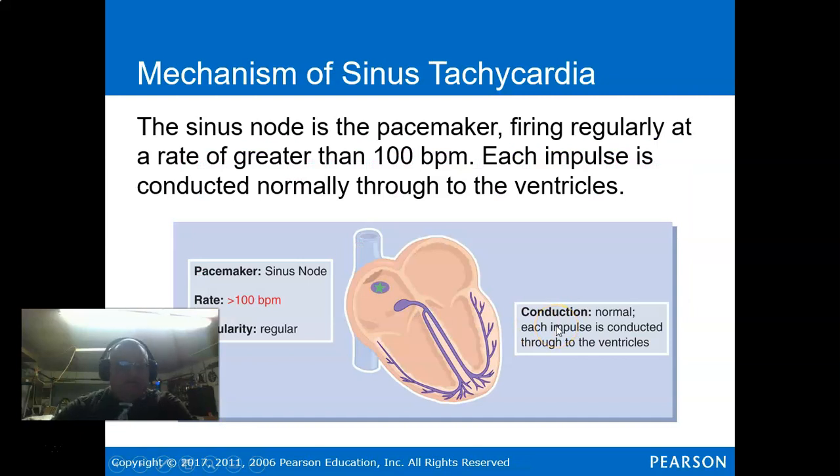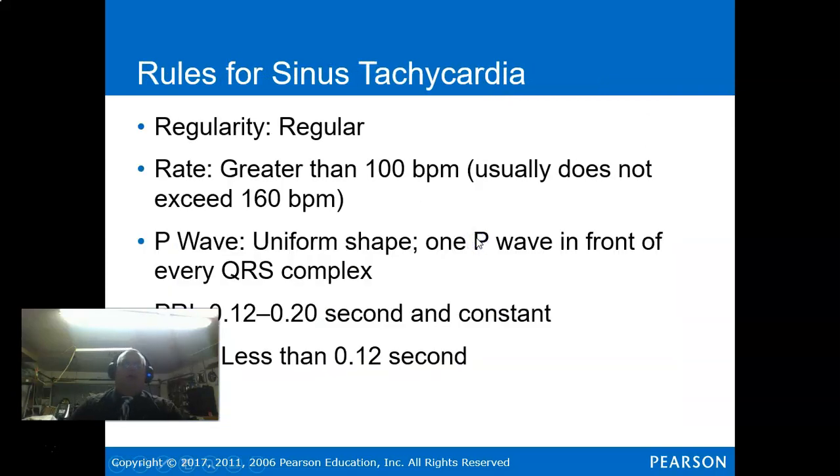Tachycardia is the same thing as sinus rhythm, except it's above 100 beats a minute. Now, with this rule here, though, I have to stress this. It usually does not exceed 160 beats a minute. It can, and that's where I'm going to teach you guys a really important number that, yes, you do need to know, or at least I think that you need to know it, which is 220 minus age.